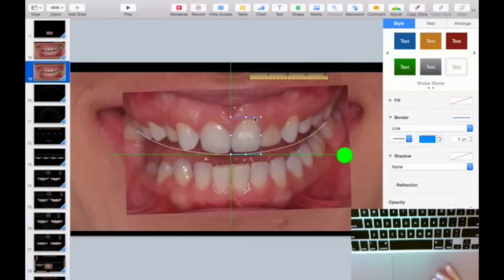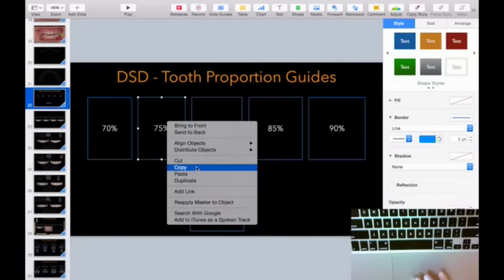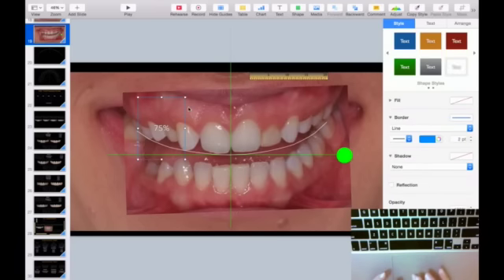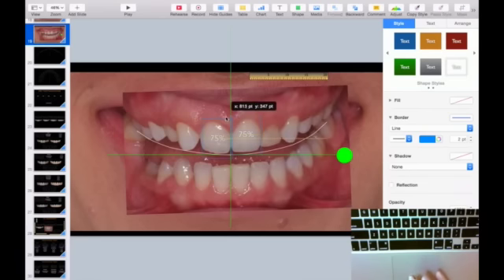I'm going to say that she needs, let's say this one. I'm going to say she needs a 75%, just because of the gum line that she shows a lot. I'm going to go up there a bit. See there, I cover a little more of the gum. I think it'll look good for her. So I duplicate this and I bring it to my other central.